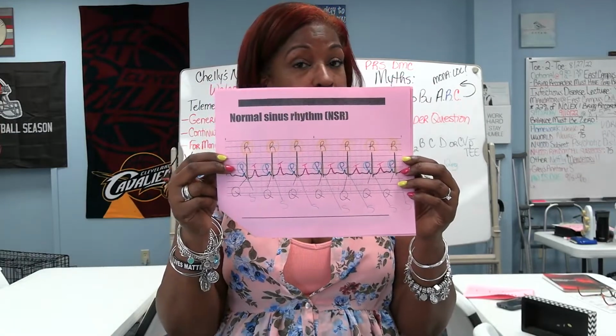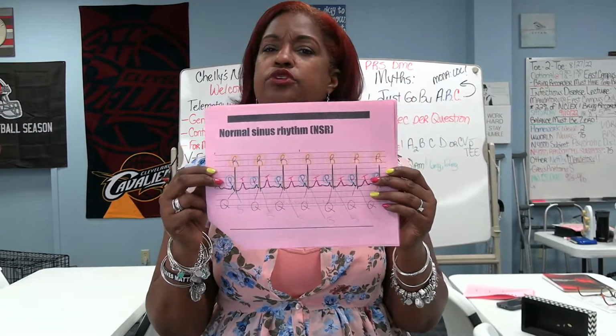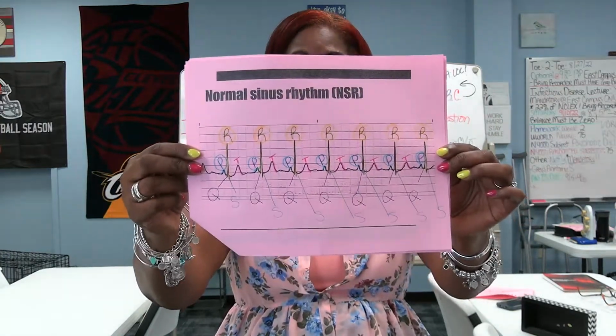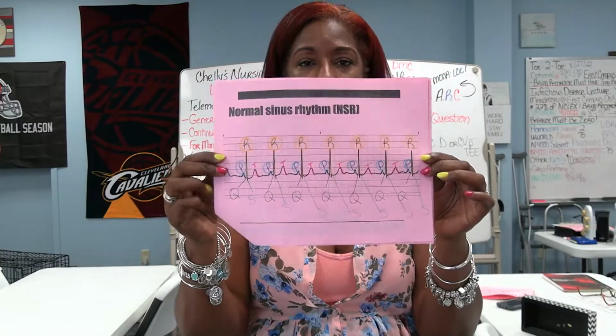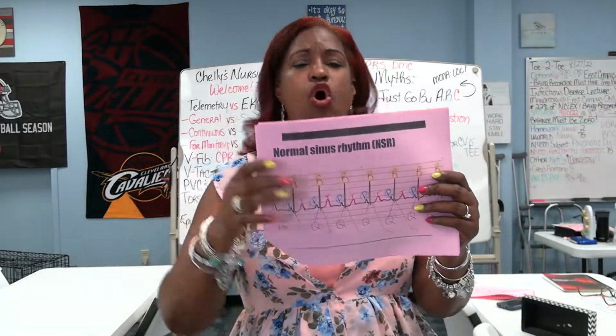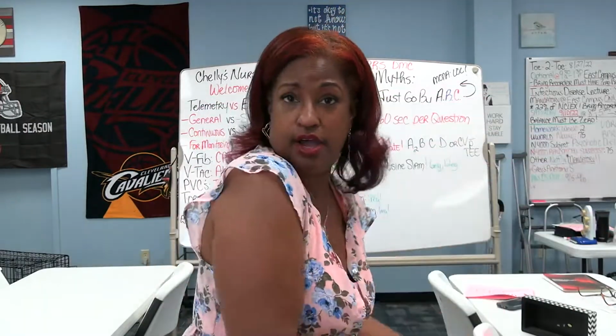And the P's are there. What did we say about P's? They're predictable. Here's another tip about P's. For your purposes and mine, the P must come immediately before the QRS. It can't be down the street picking up some cigarettes. It can't be over across the way looking at the Browns game. No, it's got to be hugged right up against the QRS.